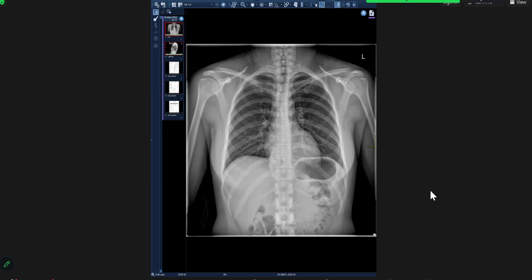I can see all the bones are normal in density, I cannot see any osteopenia or any coarse trabecular pattern to say that this is extramedullary hematopoiesis, or any vertebral irregularity to suggest that this is a paraspinal abscess, or in the posterior mediastinum it can be a foregut duplication cyst.